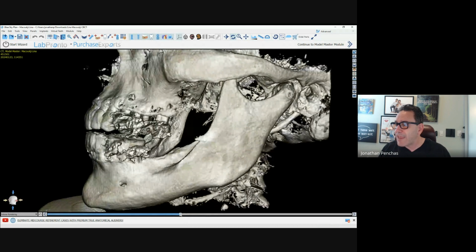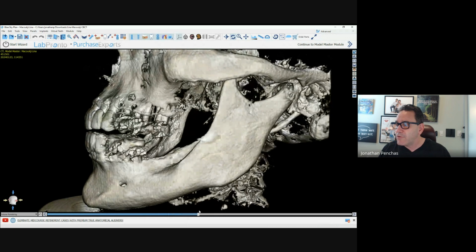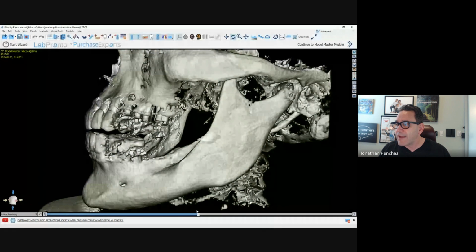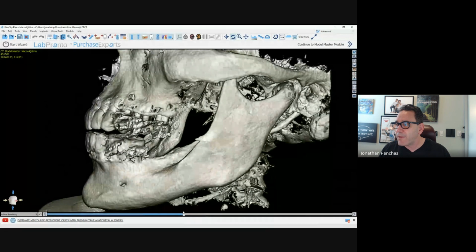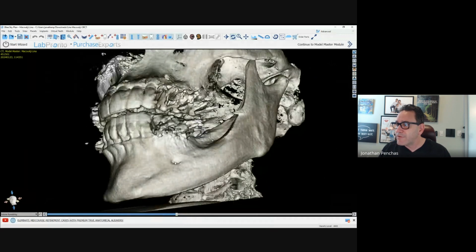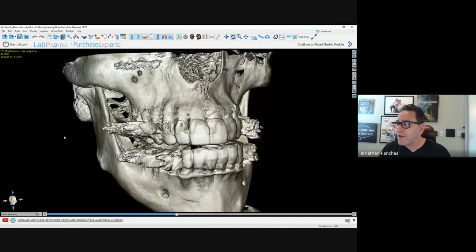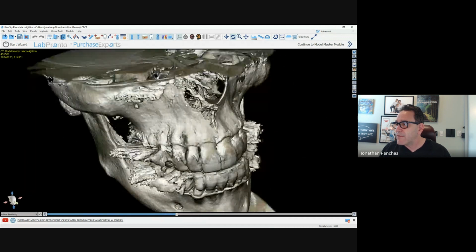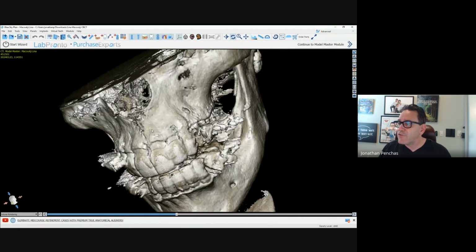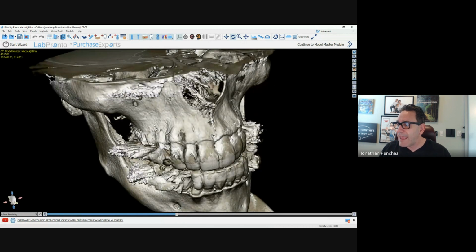Now, we can reduce the scatter a little bit, but when we reduce the scatter, we lose some of the bone formation because it's moving it. So I'm adjusting some of the scatter, but you can see the maxillary bone is disappearing because it's so thin. Here we see the mental nerve. We see some of the infraorbital nerves coming out here, right up here, and right up here. And usually, remember, if something is showing in both sides bilaterally, it's usually something anatomical.